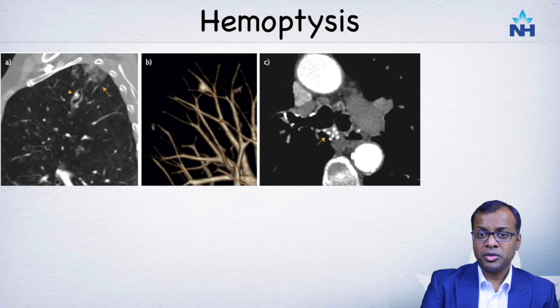Patients who have bronchiectasis often present with hemoptysis. It may be disregarded as just bronchiectasis, but you definitely do not want to miss any focal aneurysms or any focal bleeding points in these patients. So it is important to assess the pulmonary arterial system as well as the aortic system to see these bronchial artery collaterals, which can then be embolized in appropriate patients.